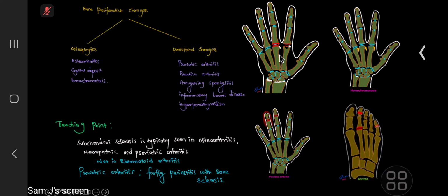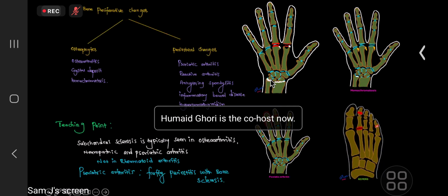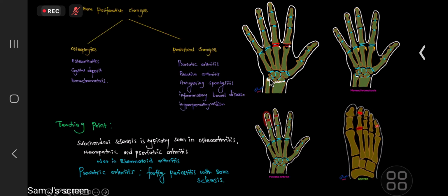The example here is you can nicely see multiple hook-like osteophytes and also joint destruction, predominantly involving the second and third metacarpal joints, which is very classic for crystal deposit disease. Also look at the ossification or calcifications of both the ulnar and the radial aspect of the triangular fibrocartilage ligament complex. These are a very classic picture for crystal deposits, especially calcium pyrophosphate crystal deposit disease.